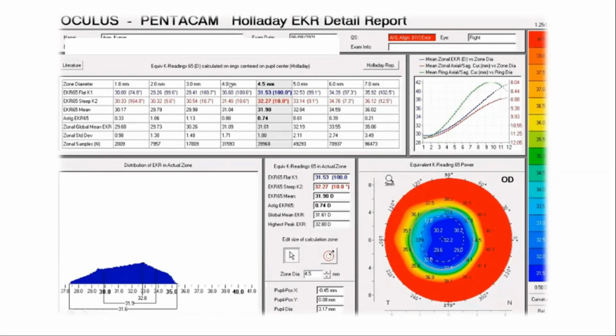Yes, sir. Actually, on a day-to-day basis, for all practical purposes, we mostly look at just the quad maps and the Belin. So it's a good refresher on all these maps that we tend to ignore most of the time. It's good to understand them better. Yeah, it gives us a lot of information if we sit and play around with it, even for our cataract surgery and post-refractive surgery patients, and in many areas, I think there is lots to pick up from the Pentacam.